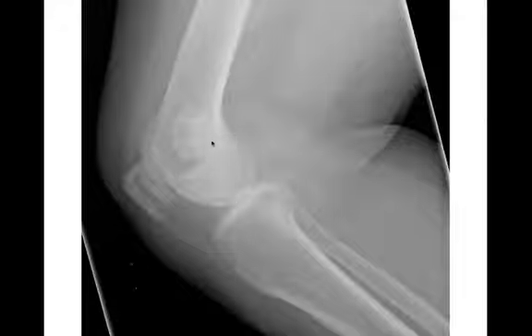There's a lateral view of the knee, geographic lesion, narrow zone of transition. This one has a classic chondroid matrix of an enchondroma. It's centered in the metaphysis of the distal femur. I guess you probably truly want to look on the frontal radiograph to make sure it was centered. I'm not showing you that one, but in this case it was. And this is a typical location and appearance of an enchondroma, with this classic chondroid matrix.